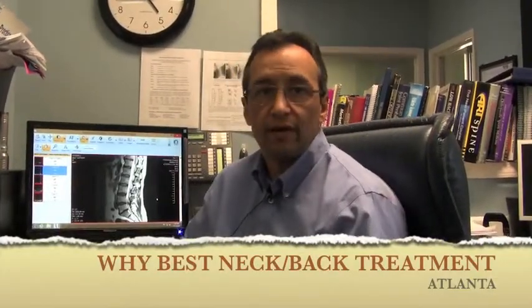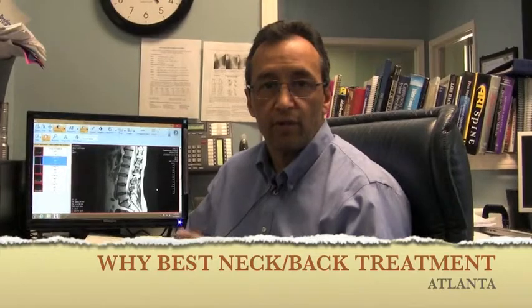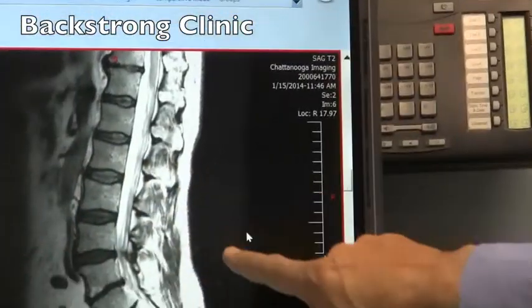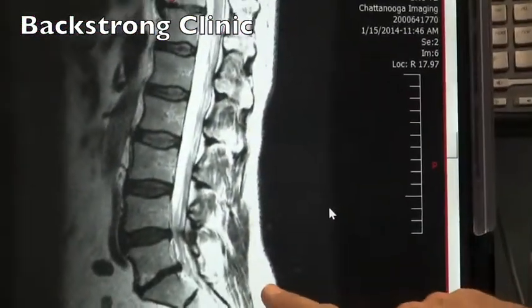I'm going to show you what I mean on an MRI scan about compression being the source of pain. So let's pan over to an MRI scan as an example. Look over here for a moment if you would. Marianne, are you in on this lumbar MRI scan?